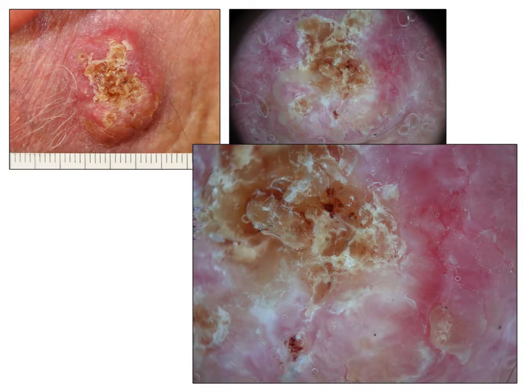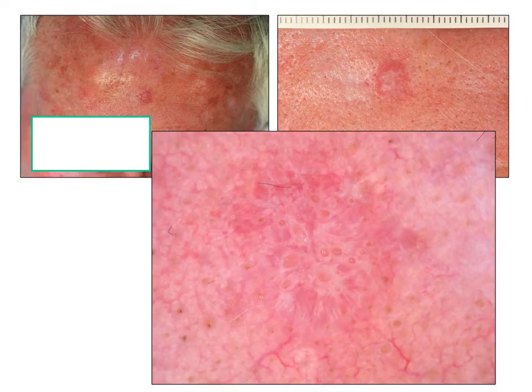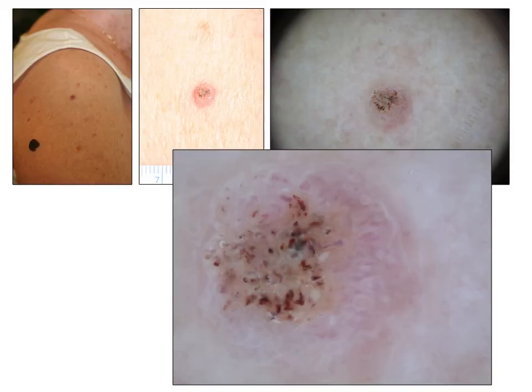In more raised lesions, the keratotic plugs are so big that you can see almost only keratin, and in some cases these whitish cysts also indicate the presence of a deeper lesion. So superficial lesions are diagnosed on the basis of the vessels, but also the white circles, whereas thicker lesions are based on the aspect of the vessels in the periphery, the presence of purpura and some pigmentation.